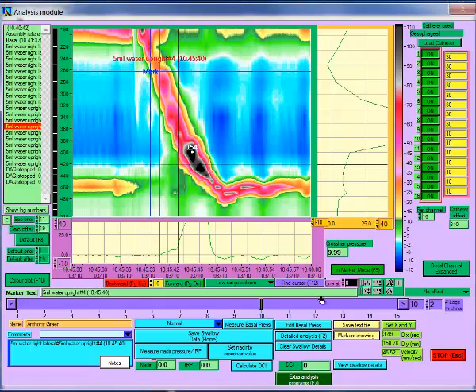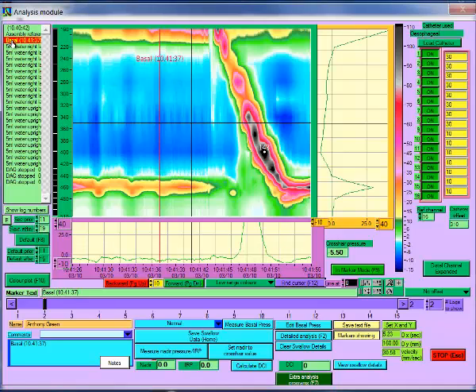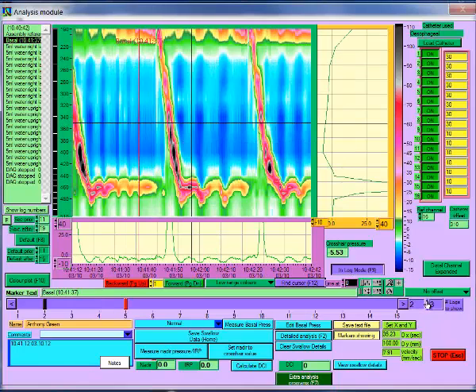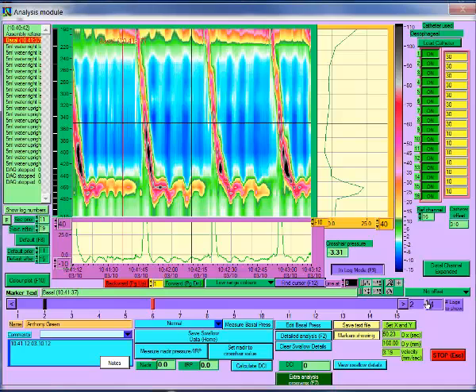The first step in an analysis is to measure the basal sphincter pressure. You need to display a period of data to analyse the basal pressures. If you have a marker for the beginning of the basal pressures, go to that and then change to data log mode. This will display the data from that point. When you are satisfied that you have an appropriate period of data displayed to determine the basal pressure, click on the Measure Basal Pressure button, which will bring up the basal pressure measurement screen.